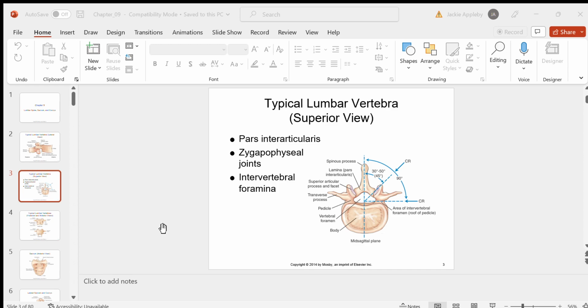So what you're looking for is the density. You're looking for extra density in that area, and I can see here and here. I can outline the ones above. You might need to maybe be closer like I am, right, or have a larger image like I have. But you're looking for the faint outline of them. Now it's hard, right, because there's a bunch of overlying stuff. This image is not good for viewing those articular facets. We have a special image for it.